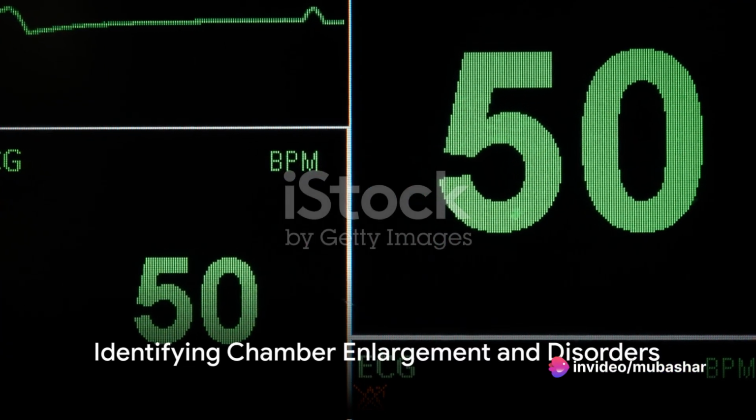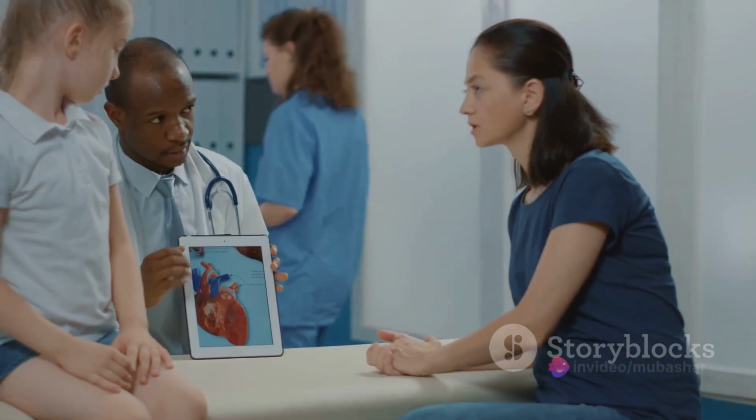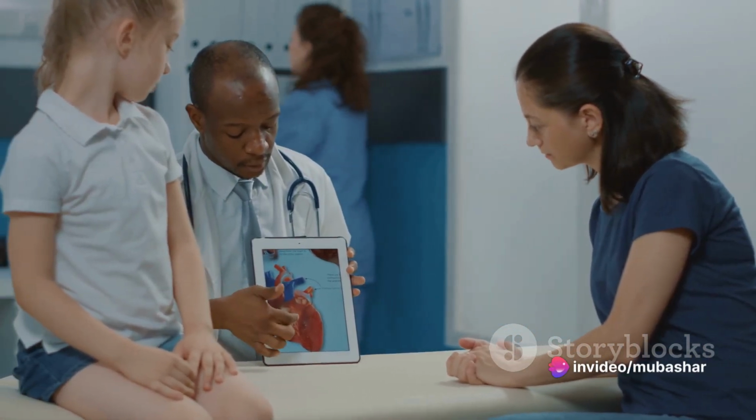Lastly, we have the long QT syndrome, which is identified when the QTc is greater than 440 milliseconds. This is an underdiagnosed congenital disorder that predisposes individuals to ventricular tachyarrhythmias.